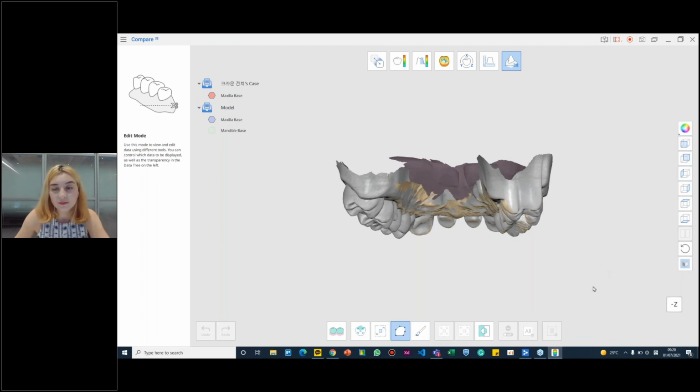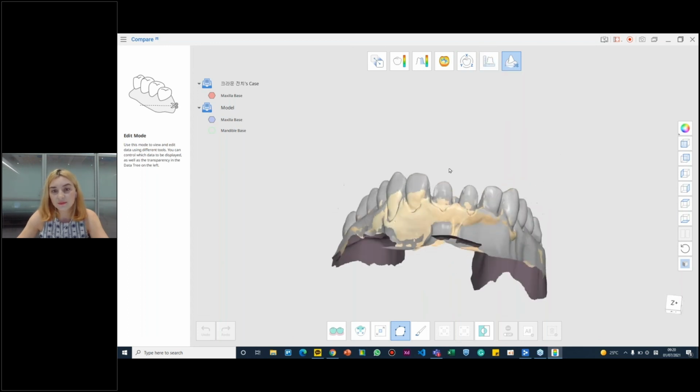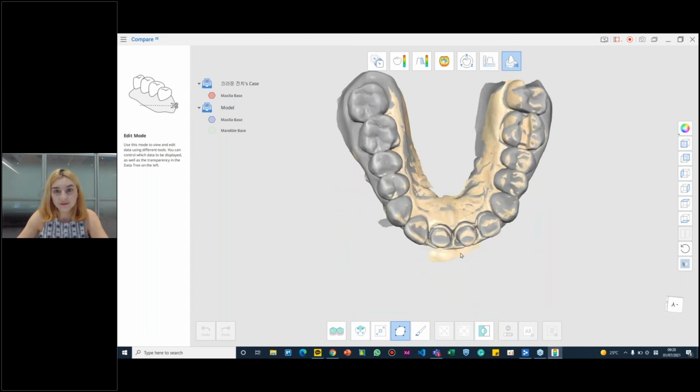This is one thing I really like about Meta, in their software, in MetaScan for Clinics and in their apps, usually you have the stages listed at the top of the page. So you click on a specific stage and the tools that you need for that stage are applied at the bottom of the page. So sometimes people get a little confused when they go from stage to stage and maybe they see different tools there. It's just the tools that you need for that stage at that moment. And I think that's kind of intuitive that Meta does that and stays consistent across the board. I like that.